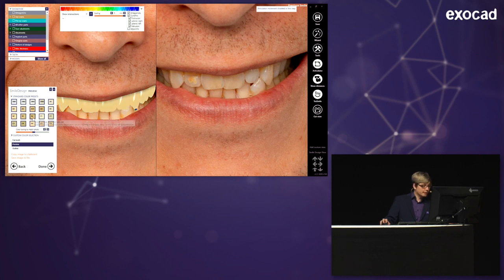Those colors aren't that different, but if I use those, you see it. And for this case, I'm choosing the B4. It looks completely different for the moment. Dragging it a bit to the C4 and giving it a little bit lower saturation. But it's still not a perfect match. But I want to show you the other option, the custom color selection, where you have sliders like you might know them from Photoshop. We could use those. We could also use this color picker. And there's actually two colors here, the base color and the highlight color. And for this, I want to change the base color. And I'm clicking on a dark point. And it's matching the photo more closely.